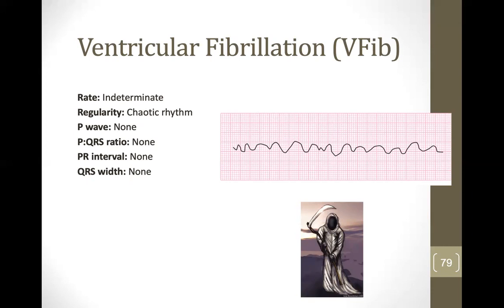Remember, fibrillation means to quiver. Ventricular means it's coming from the ventricles themselves. So just imagine we've got a sack full of worms and everything is just firing all over the place and you can see all this electrical impulse on there. The heart is not beating, blood is not pumping around. They are in cardiac arrest. They are clinically dead at this point and we would be doing CPR.